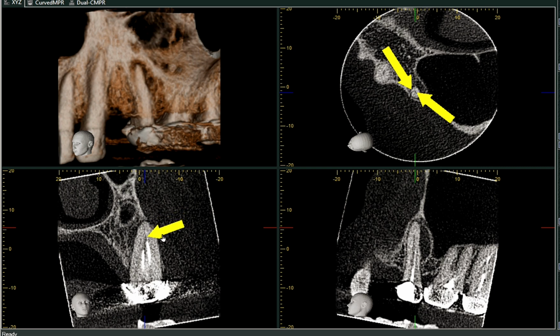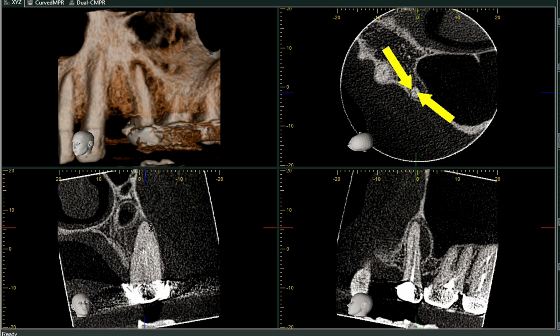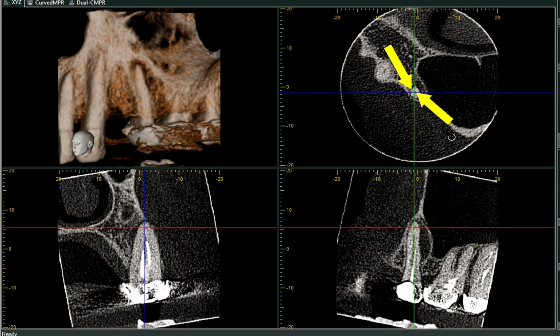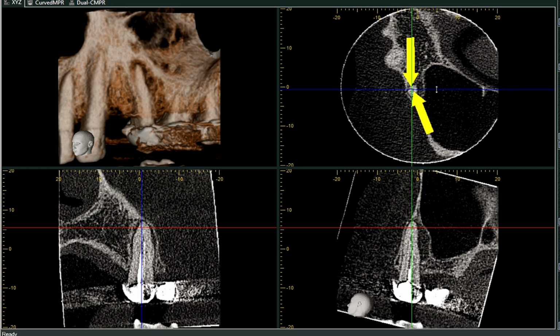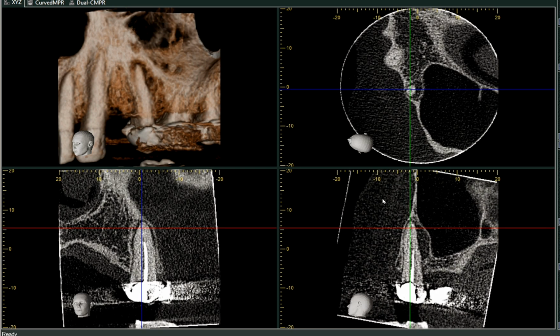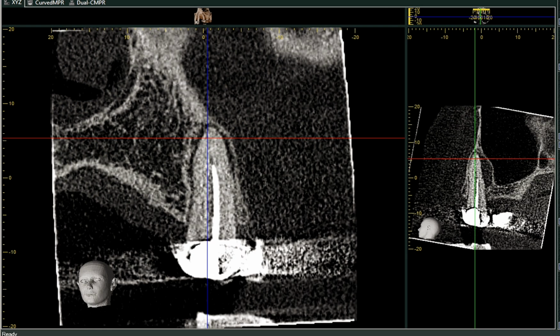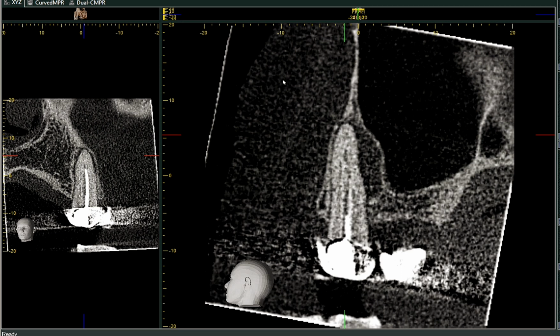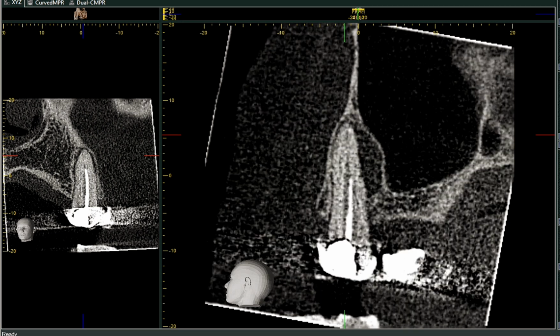This entire thing is the pathway of the root canal system, and there is evidence of a lateral canal exit as seen in the axial cross section. You can arrange it along the long axis of the lateral canal and appreciate it as well. This is the area of the lateral canal, so you can zoom into that specific area to view it. Similarly, you can see the lateral canal, if evident, in the periapical region in the sagittal aspects. There are chances that this could be the lateral canal, this and this.